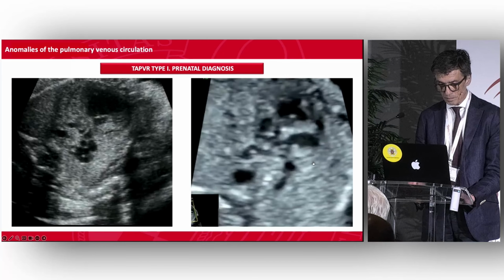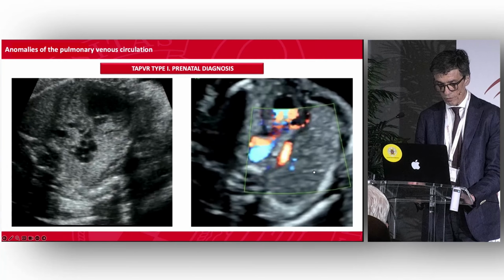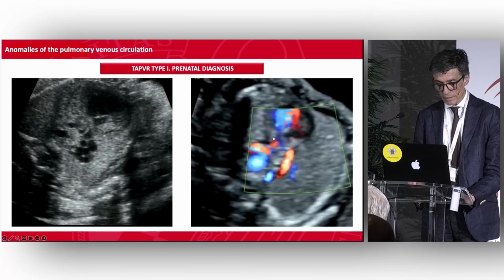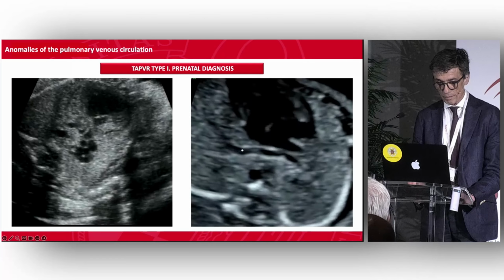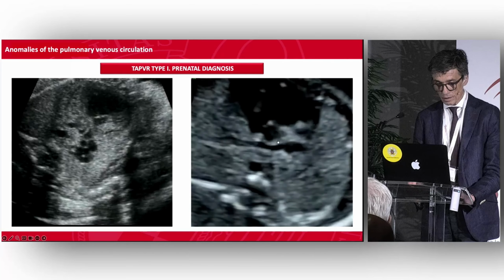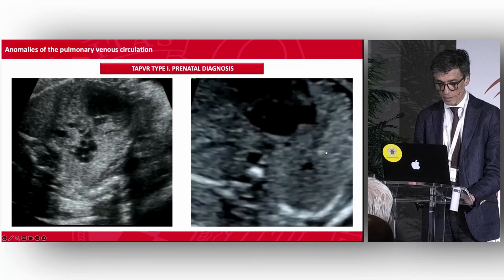But these are the pulmonary branches that are very small, filling from the arterial duct. But let's see these abnormal vessels behind the left atrium. You may see here, crossing in a transverse plane from the left to the right.